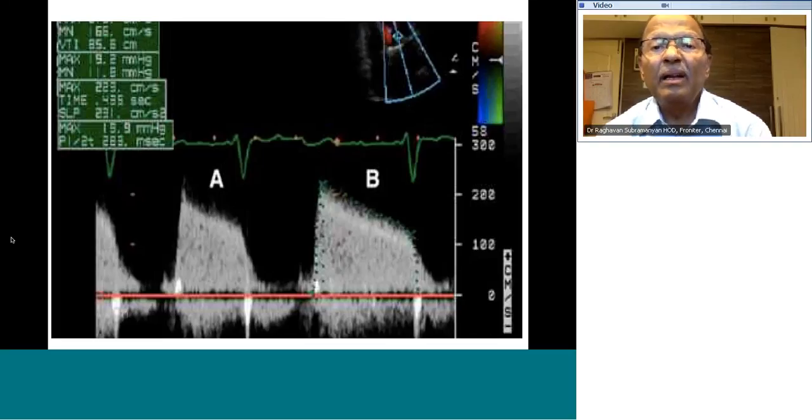Don't say the gradient across the mitral valve. How do you describe it? Describe it. That's the way to answer. I'm asking you, what is this picture? Anybody else? Now, that's not the way to describe this picture. You don't say gradient. What is this picture? You have to tell me what this picture is first. I'm going to wait for another 5 seconds.